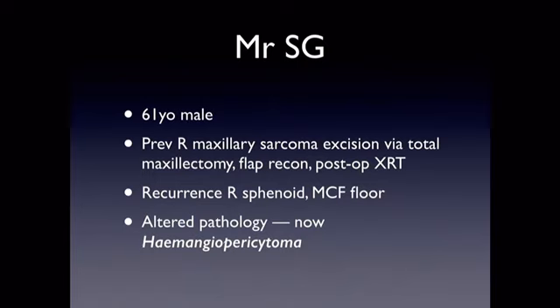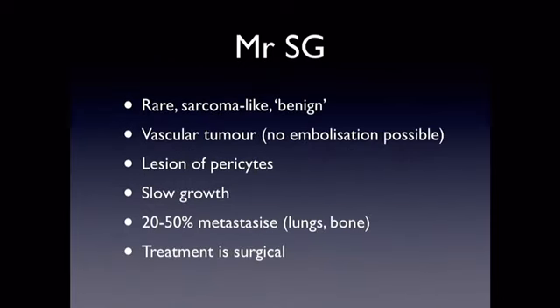And so he had a biopsy done by another surgeon in our unit, came back as hemangiopericytoma, which can occur sometimes after previous surgery, like in a sarcoma with radiation treatment, it can change in its morphology. So hemangiopericytoma is benign, but it requires surgical excision. If we don't get clearance of this tumour, then it recurs. So once again, you've got to make sure we understand the anatomy of what we're looking at here.